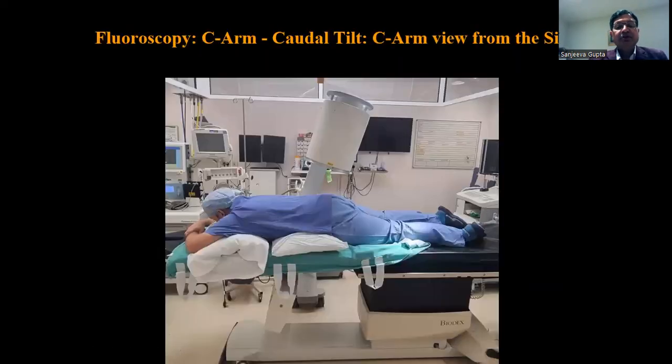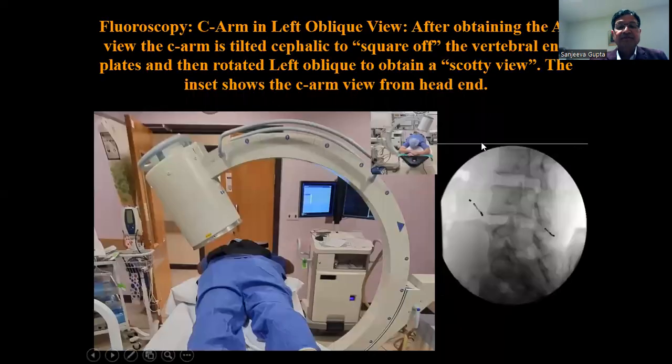Now here I'm just showing a picture where there's a caudal tilt. As I said, the top end of the fluoroscopic C-arm is considered as the reference point. And again, in this picture, we're looking at left oblique rotation, from the top end of the head end. And in that, you get this picture. So at every point, once you obtain this picture, identify the structures again.